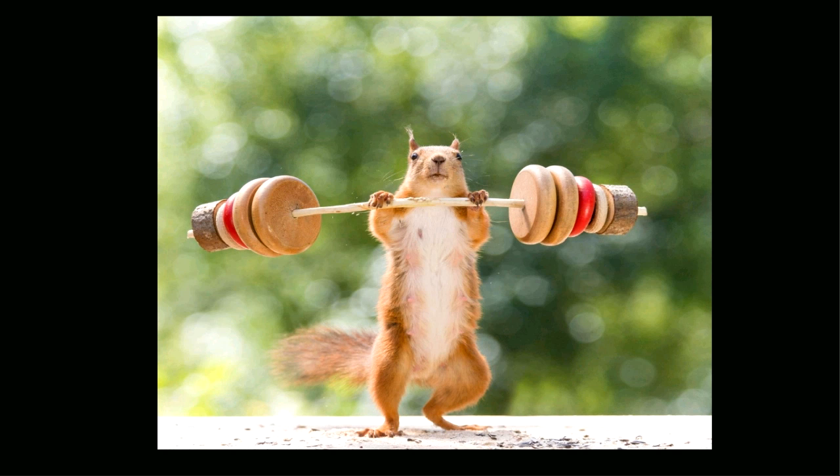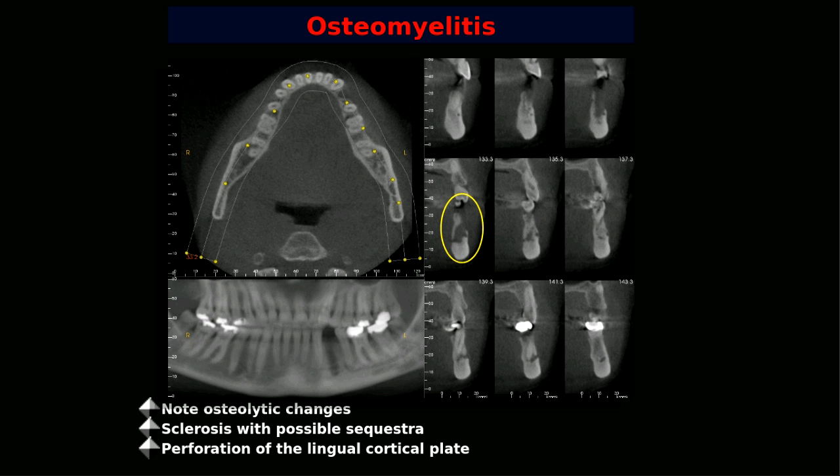And this is a beautiful image where there's a lot of heavy lifting. You're in DS4, now about to finish dental school. I'm very happy for all of you. But still, I think if you learn CBCT, it'll make your life much easier. Otherwise, you have to work very hard. So please learn CBCT. That will make your life very easy.